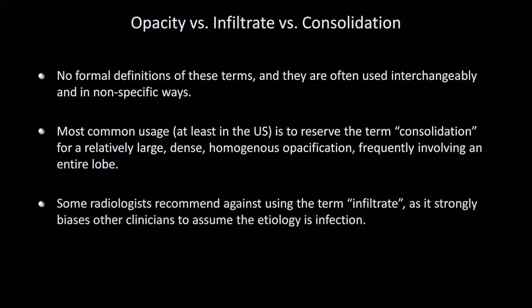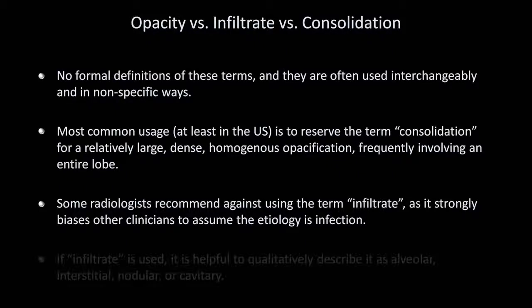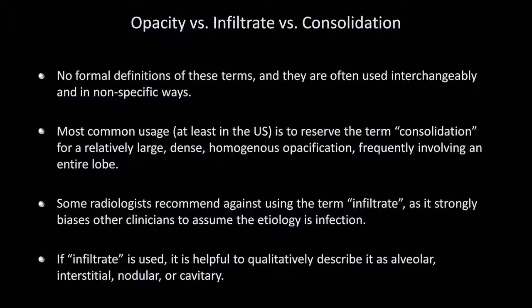Some radiologists recommend against using the term infiltrate altogether, as it strongly biases other clinicians to assume the etiology is infection. If the term infiltrate is used, it is helpful to qualitatively describe it as alveolar, interstitial, nodular, or cavitary.